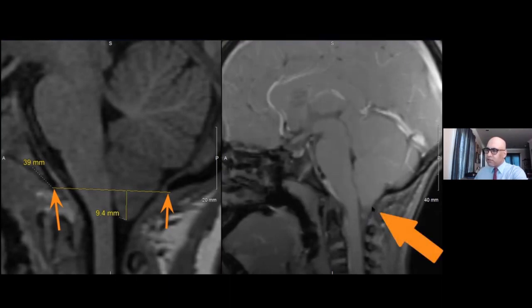We're also seeing flow posterior to the brainstem at the level of the foramen magnum. So this is a sign that at the time the study is performed, there's not a significant alteration in CSF flow dynamics at the level of the foramen magnum.